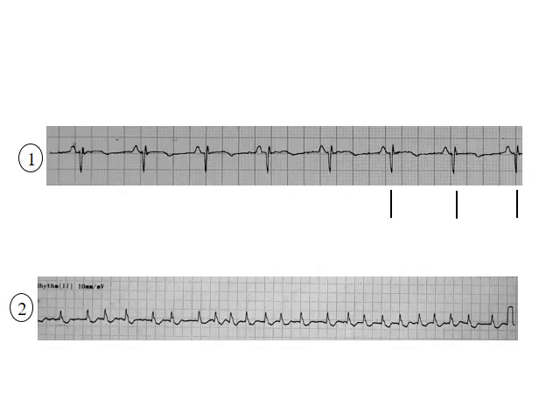Let's repeat this process with an irregular rhythm. We place the markers as before, but because this is an irregular rhythm, we'll find that the markers do not line up.